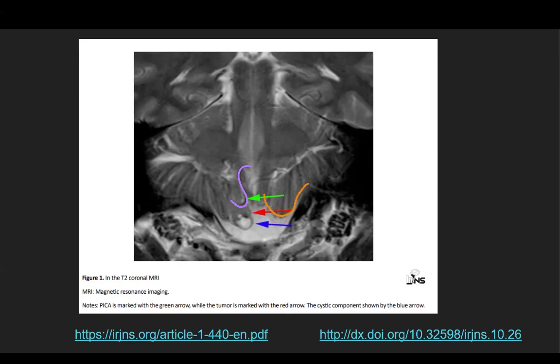This is where the cerebellar tonsils are, right? This is where the cerebellar tonsil is. And within the tonsil, on the right side, there's a small lesion hiding here with a solid cystic component. This region is solid, and then there is a cyst within it. It's so small, it's pretty easy to miss. This is one of the rarer presentations, not very typical, but it happens.